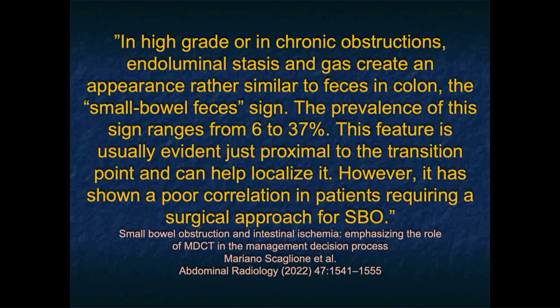And so this article recently spoke about the small bowel feces sign. Up to a third of cases, this feature is usually evident just proximal to the transition point and can help localize it. So I'm always very careful looking at what I would say is the fluid pattern of the bowel. Is it all fluid? Is there a transition? Very important to recognize that.